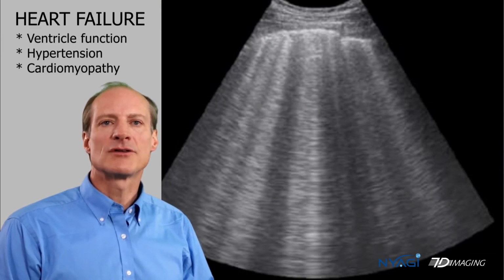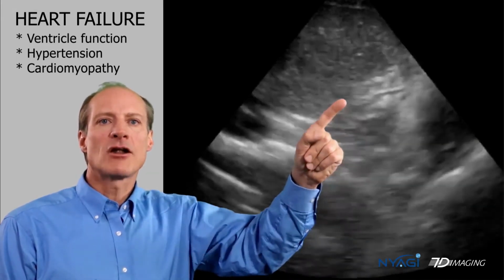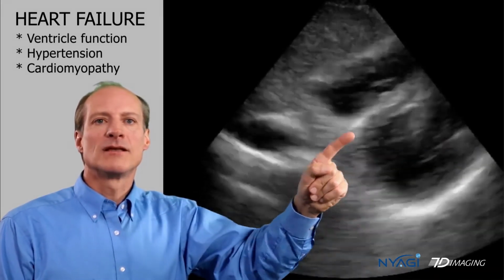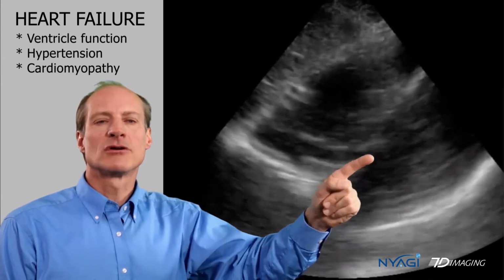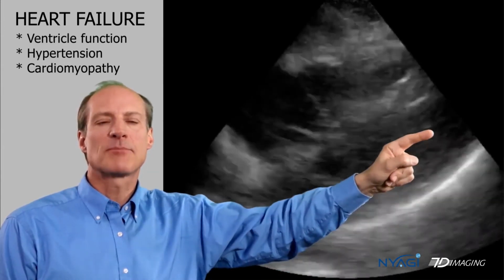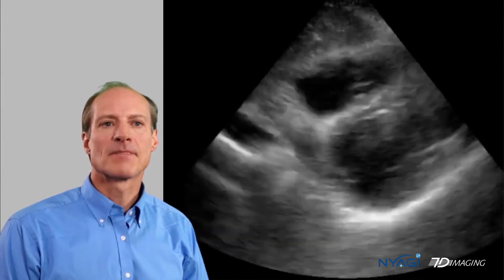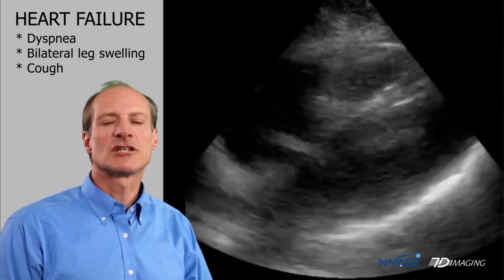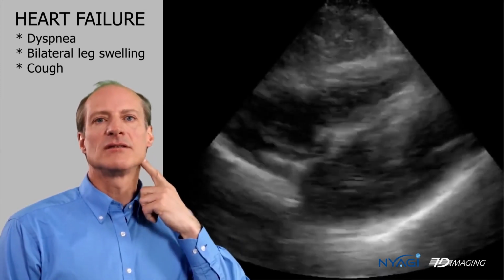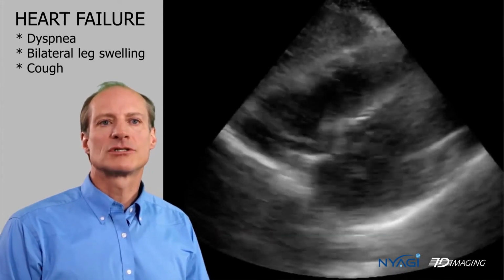You can also look for other signs of heart failure by looking at the heart. Look for right heart strain, the contractility of the ventricles, and you may even look for a tamponade, cardiac tamponade, which may cause decreased lung efficiency. Clinically, with congestive heart failure, you may see jugular venous distension, swelling in the legs, and of course, shortness of breath.